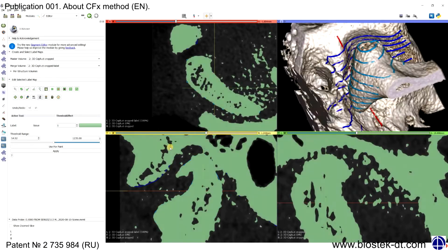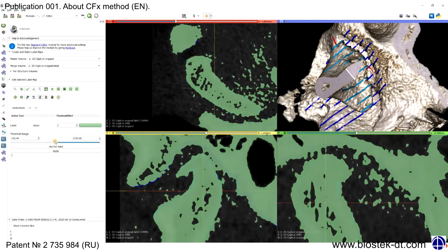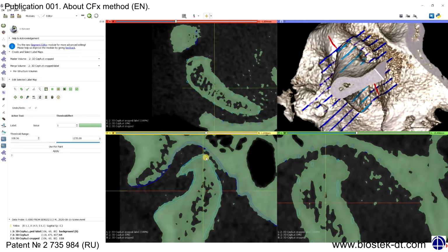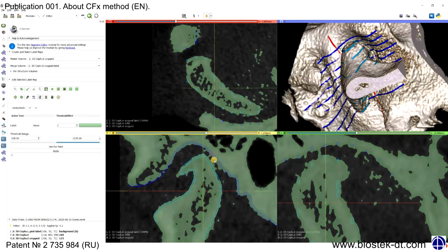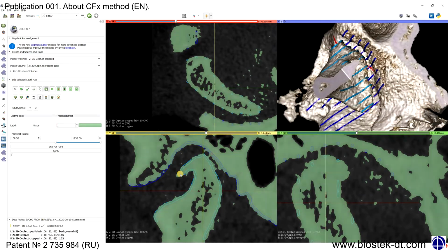Attempting to adapt the segmentation map to the anterior border of fossa, we get excess volume in other parts of fossa, alteration of condylar borders, merge of borders of condyle and fossa, the presence of segmentation map islands that are not related to segmented object in this task.